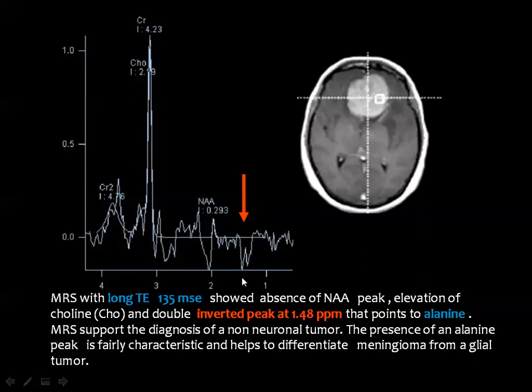Then one may ask, how can you know that this is not lipid? This is not the lactate peak, which is also a doublet and is inverted in this long TE spectrum. I say that you go to the original MRI images. If you see that the voxel is present on a homogeneously enhanced lesion, then you know that you are dealing with a meningioma, and this peak will be alanine.